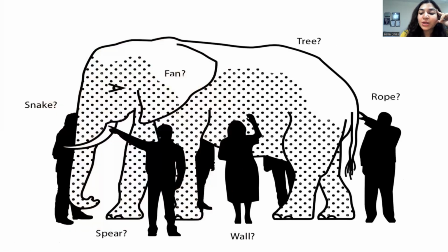Okay, fine. So after having a little bit of drill of many lesions, considering their patterns, their colors, and their symmetry, now let's focus on one point checklist or the elephant approach. The elephant approach is the one in which you come across some lesion, I tell you that this is melanoma or a BCC or an SCC, and then you are supposed to memorize the lesion.